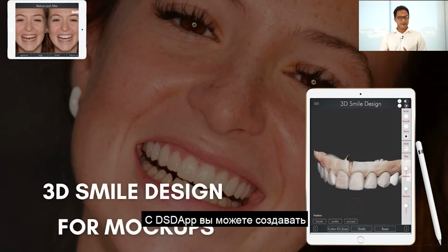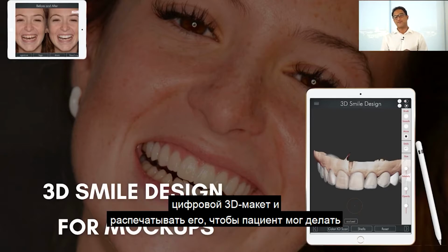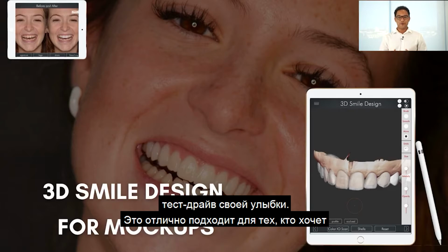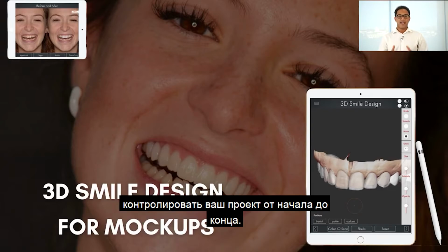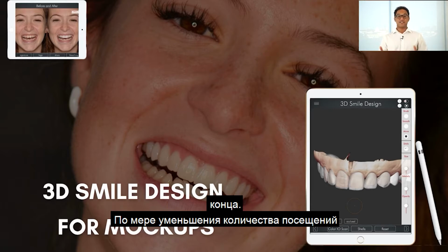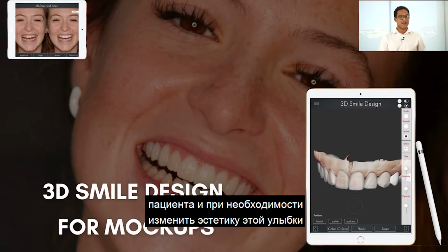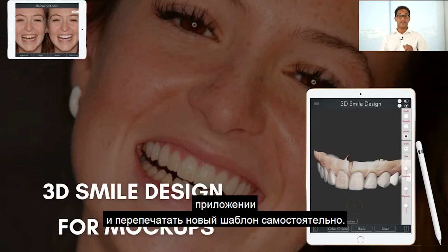With the DSD app iPad version, you can create a 3D digital mockup and print it so your patient can test drive his or her smile. This is great for those who want to be in control of their project from start to finish. As the number of the patient's visits decreases, and if there is a need to change the aesthetics of the smile, the dentist can readjust the work in the application and reprint the new template in-house.